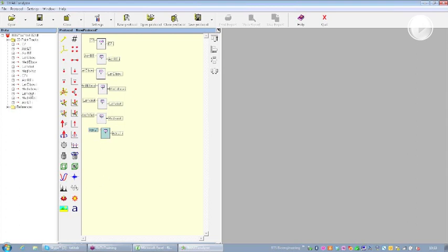You can see that every time I create something with a processing here on my report, it is going to be displayed over here. So I will have C7 interpolated, acromion right side interpolated, and so on. So everything that I create here can be found here.